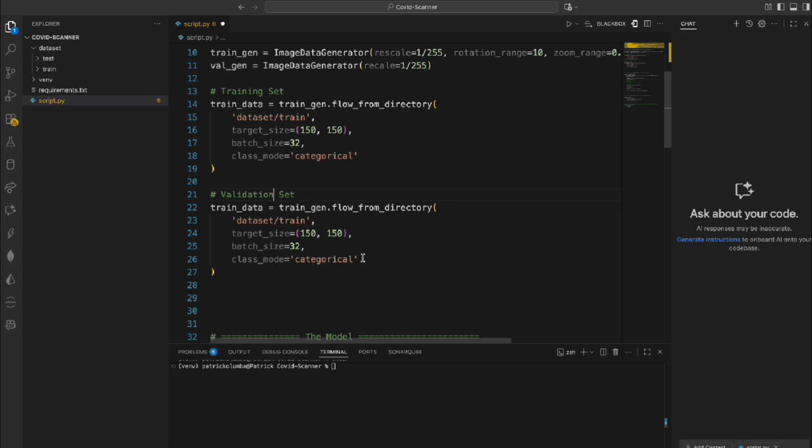Here there's one important thing we've got to put to let the model know that, hey, you've got to split the images in the train set up and give us something to validate with. For us to do that, we're going to call subset here. Don't forget this is very important.